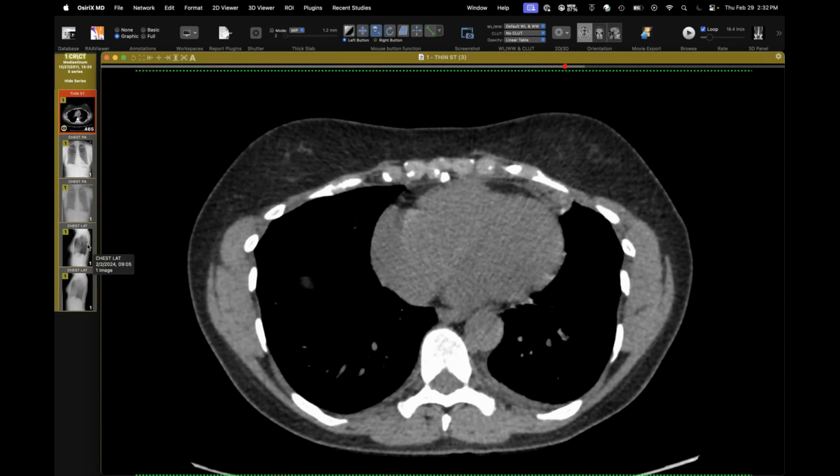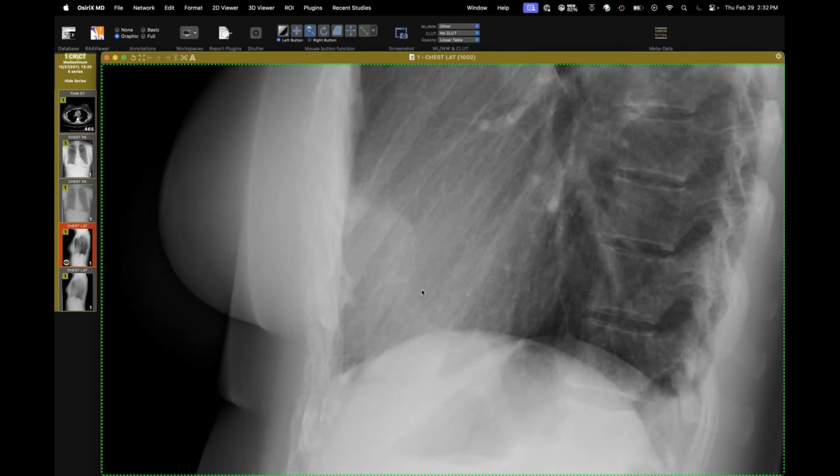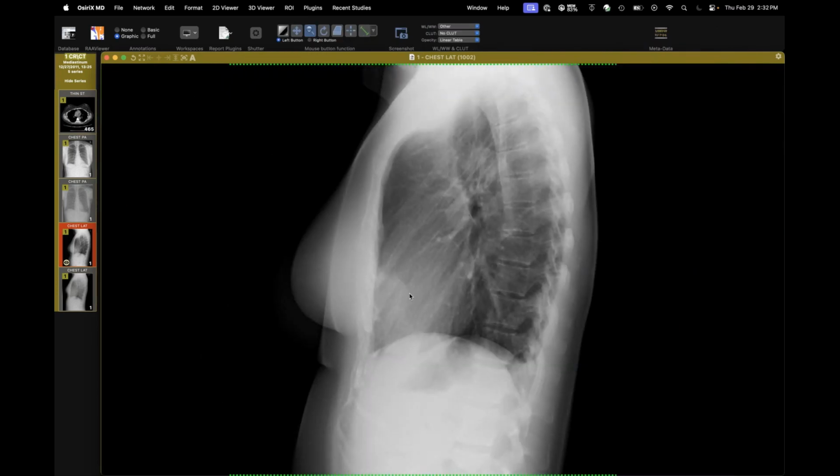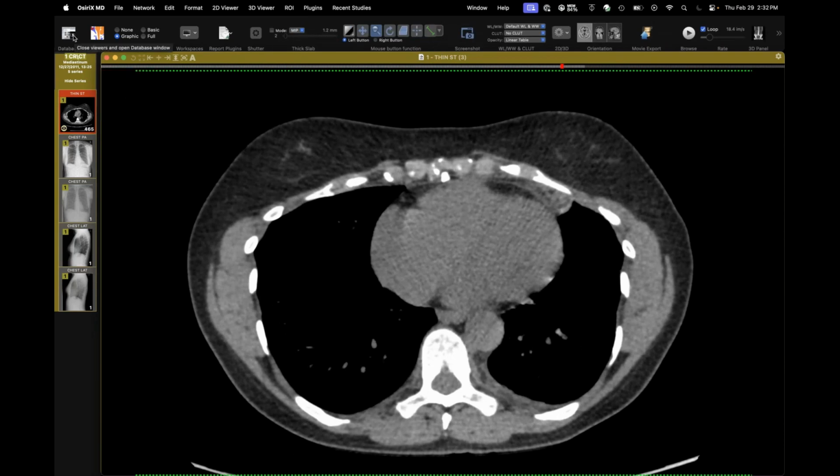case on a radiograph before. So kudos to the radiologist who picked that up. That's why it's good to have a comparison and always look in your retrosternal, retrocardiac, and retrotracheal clear spaces. So mediastinal fat necrosis, benign, give them some NSAIDs and send them on their merry way.